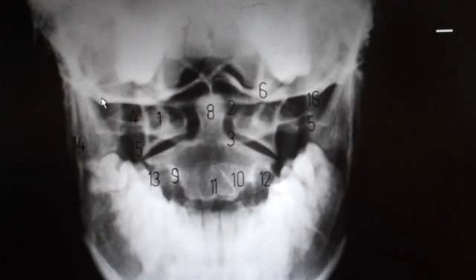Now, a couple of things that's not numbered on this film is that when you look at this density change right here, sort of a half circle, right along right there, that is the foramen magnum, right there. And we also see the 2 front teeth, and there's the gap between the 2 front teeth. So there are the 2 front teeth.